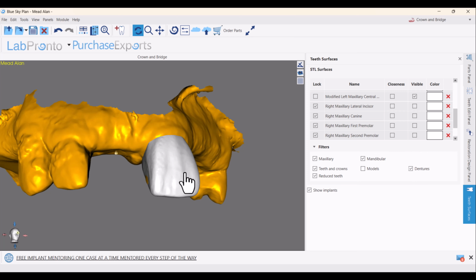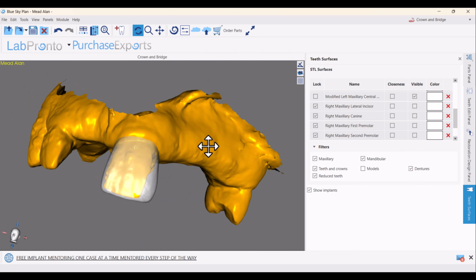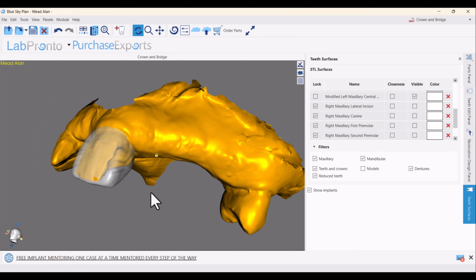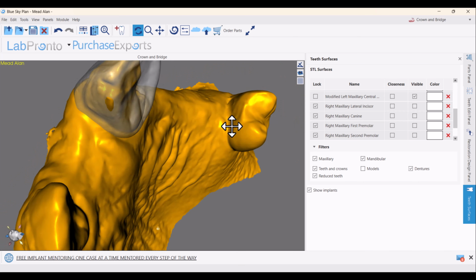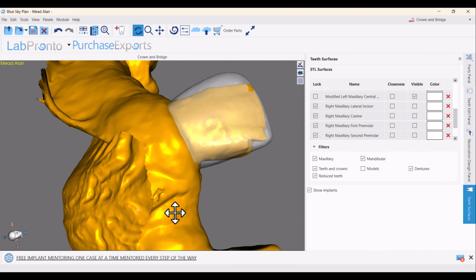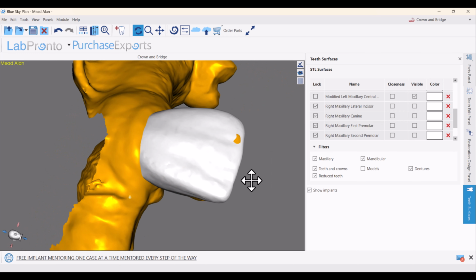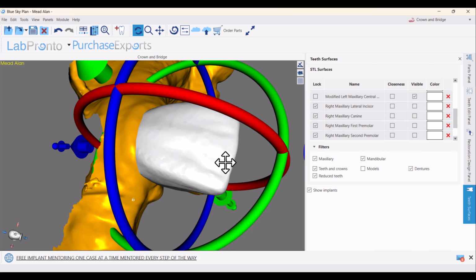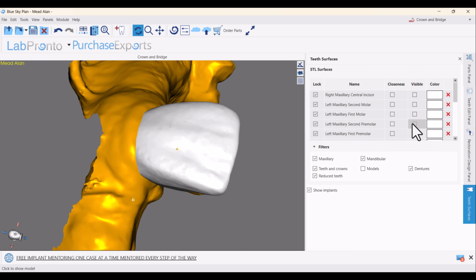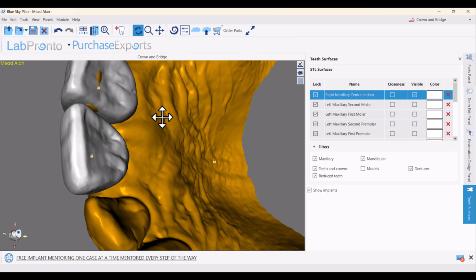And if we hit toggle transparency, so we can see, we've added a lot to the distal of that tooth, but that tooth's already cracked off in the distal right there pretty good. We really haven't increased the vertical, the facial and the incisal that much, in my opinion, honestly. Let's bring it over a bit to give him a little more width right there. Good. Let's lock that. Great. So, the right central right there. I like the way it looks.